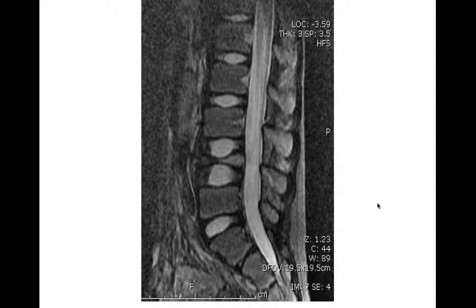This is an MR in a child, showing you again what vertebra plana looks like. This is just a nice example on MR showing you that this vertebral body is nearly completely collapsed and flattened. And in a child, when you see this, you should think about EG or Langerhans cell histiocytosis, and that's going to be your number 1 and your number 2 and your number 3 choices, just because it's much more common in a kid. But please don't say that in an adult. In an adult, you shouldn't really consider EG, or in younger adults, okay, but once they're over the age of 30 or so, it's very unlikely to happen. EG is found in children and young adults.